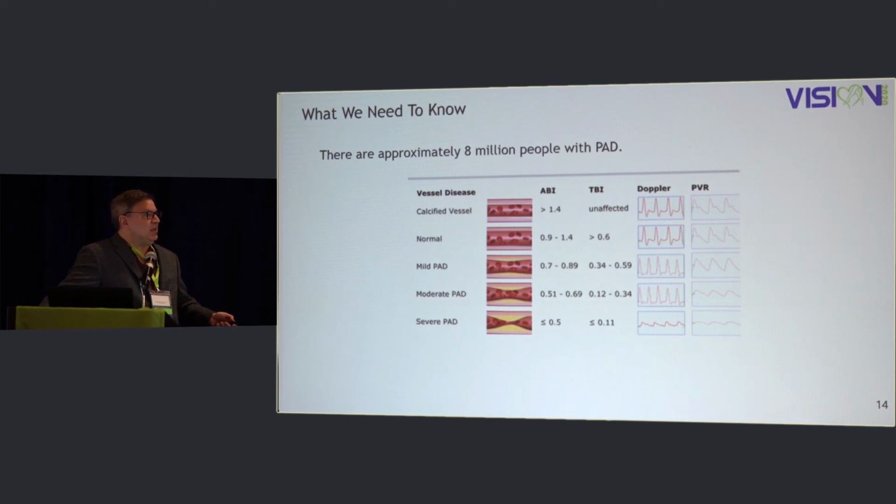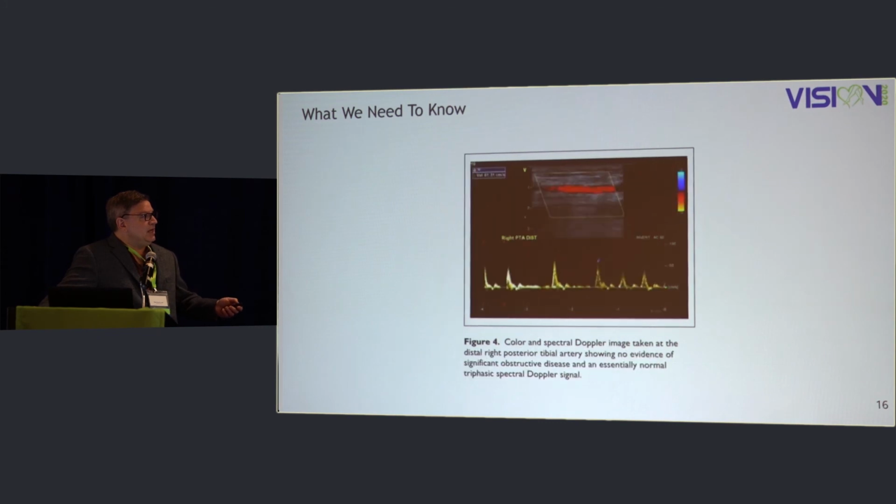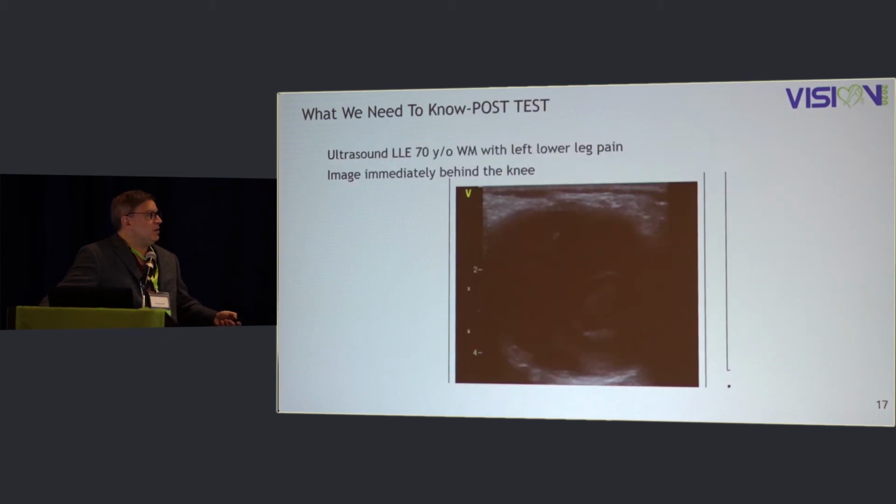But of course, down here, this patient has severe PAD and rest pain, and a monophasic waveform looks very much like the PVR, this blunted, long slope. Of course, in the PVR, you've lost your dicrotic notch a long time ago. And so we're just going to move on. So here's that occluded vessel. And here, this patient has AFib. So you can see this irregular heart rate, but they do have their brisk upstroke, sharp point, a little bit of reversal, and a small amount of antegrade diastolic flow. So that's a triphasic waveform.